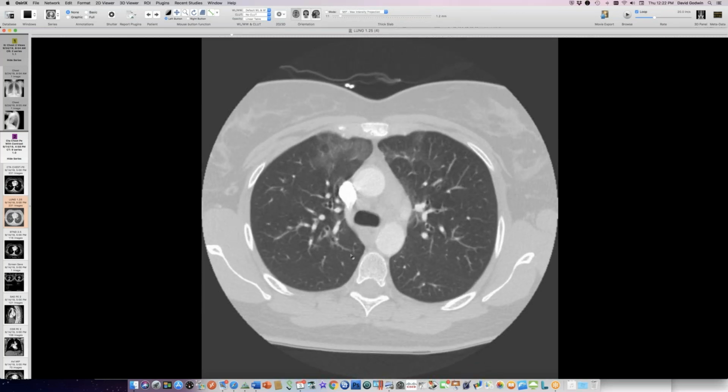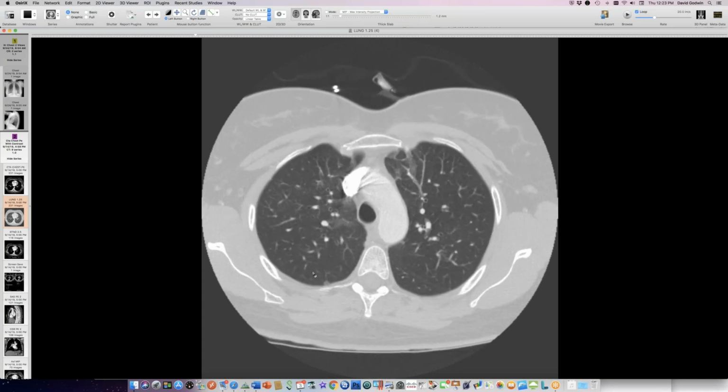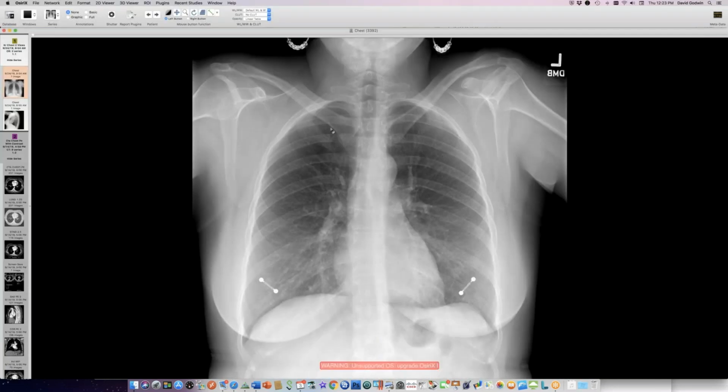And this was the second case of vaping related injury in King County, which is a county where Seattle is located. There have been, I think, 8 in the state. I don't think we've had any deaths in Washington state from this, but this is presumed vaping related lung injury. And she had a follow-up chest radiograph about 10 days later, and it shows everything's nice and clear, but you know, that subtle ground glass could be missed on a chest radiograph. So a follow-up CT would be definitive in showing clearing. The chest radiograph suggests that it cleared, but it's not 100%.